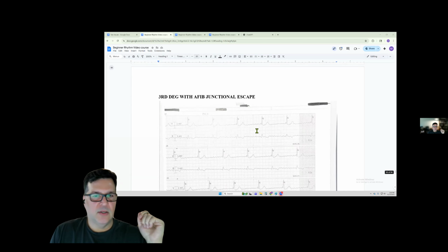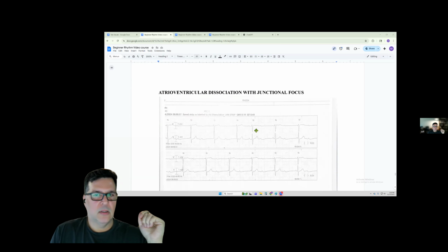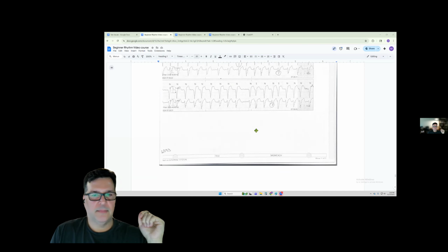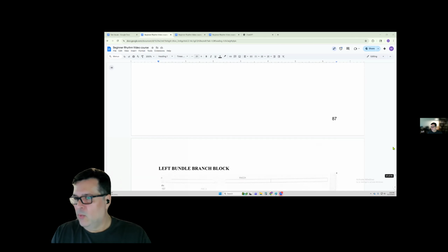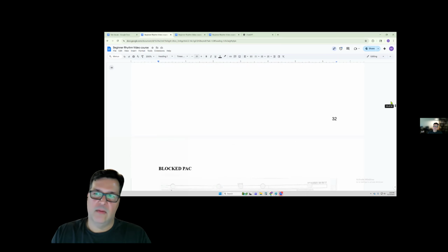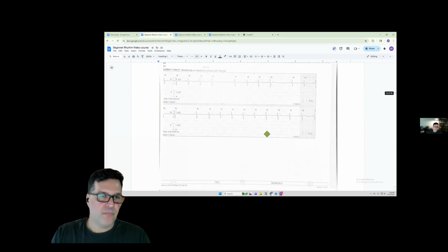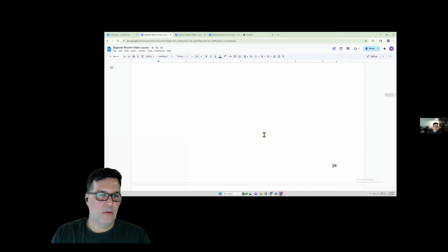I am going to go to one more thing, and I think we're good for now. We're going to scroll back up to PACs.